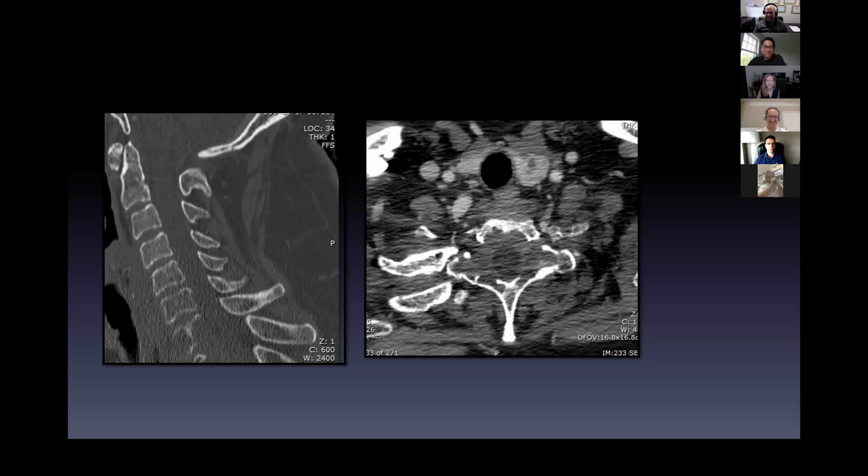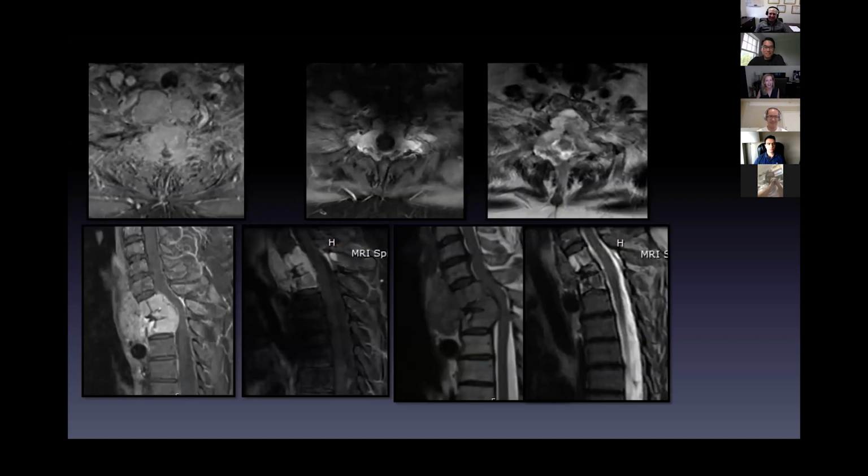That's what I wanted you to say. Okay, so we're going on here, and then I'll tell you the pathology in a minute. So this is over here. This is pre-treatment. This is post-treatment. Radiation therapy only. This was a plasmacytoma. No surgery. Look at this, it's amazing.